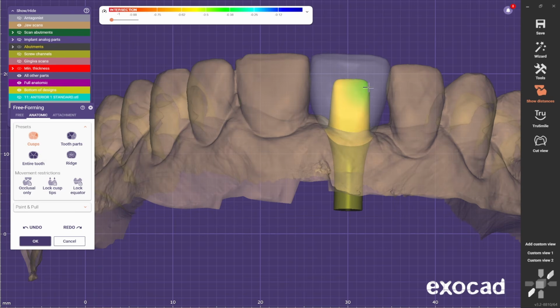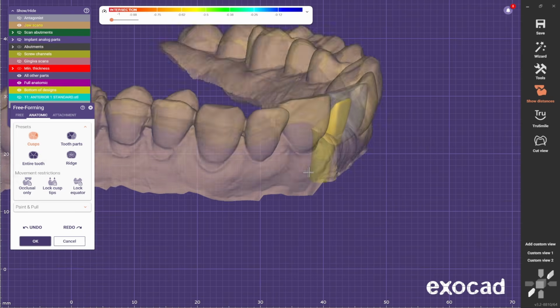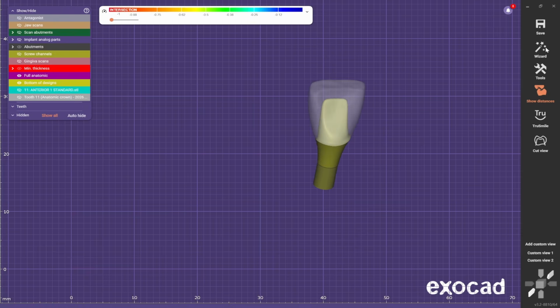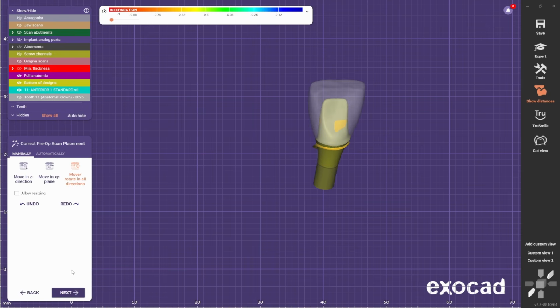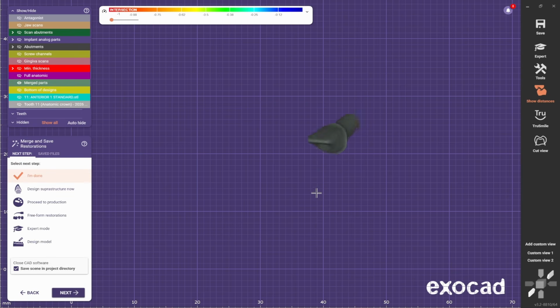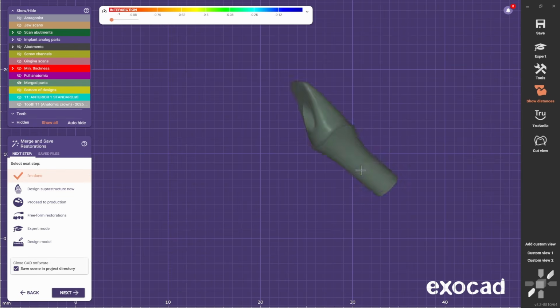Usually on my custom abutments, I like to have a bit more room and space for the zirconium material on the buccal side, because sometimes if it's too thin, it's going to shine through the cement and the shape of the abutment through the crown. So I always like to have a bigger chunk on the front and a thinner on the back.